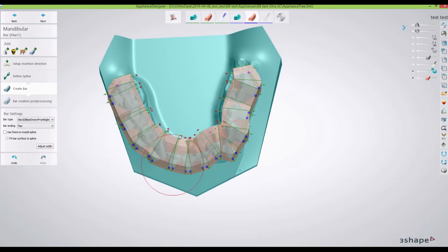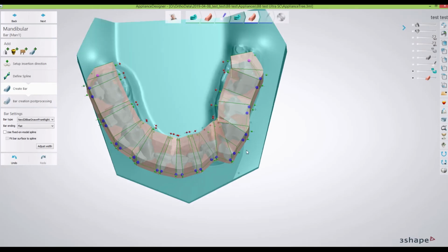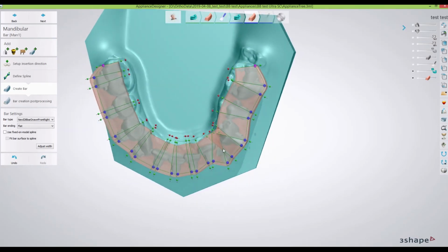And this is it. You just don't want those lines crisscrossing each other, and you can move them all. Sometimes it's hard to figure out which one goes with which. And again, if this is really boring you can just fast forward, but I wanted to include everything I learned on this one case, because this is where it can get a little tricky, trying to eliminate some of those areas that cross over one another. And I may leave one for us to play with here. Let's see what we get there.